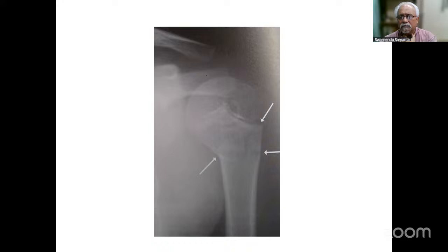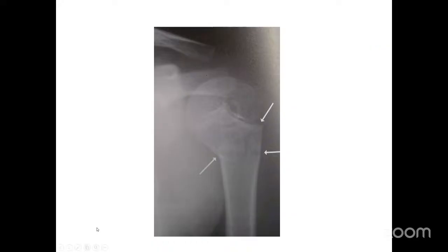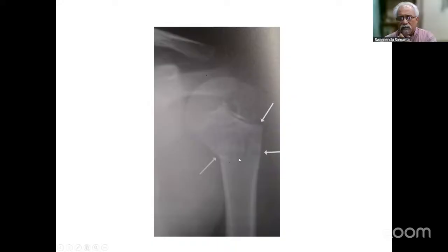I think this is, as we have already discussed during the supracondylar discussion, an AP radiograph of the proximal humerus showing part of the shoulder, where I can find a fracture of the proximal humerus. They have also given arrows over there. You can find a breach in the continuity of the bone, where there is a fracture here in the proximal part of the humerus. Okay.